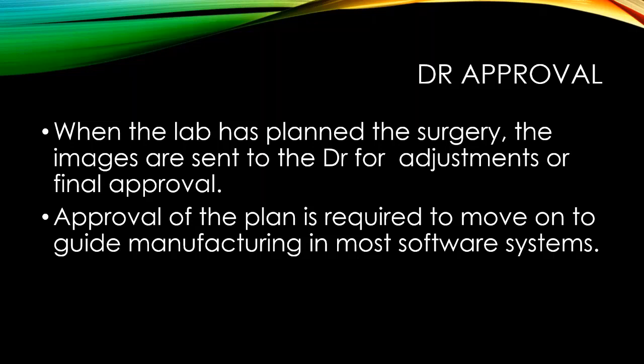Many of the softwares, we are looking at 3Shape software is what we are using right here, Implant Studio, and many of the softwares, this one included, require the doctor to make a final approval before we can move on to guide fabrication.